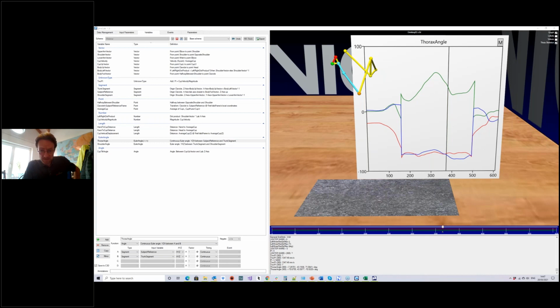What is the use of XMP over MP? The reason ProCalc uses XMP is that the MP file is a text file which does not allow you to smoothly store certain types of information very well.